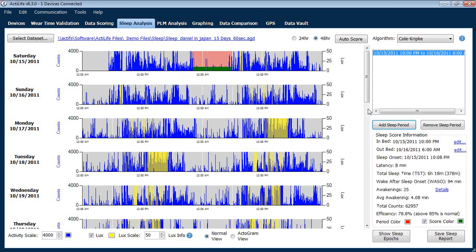Okay, a few things to notice here immediately. First, your new period has been added here. Second, we have highlighted that time span in the date on the graph that you've selected. You can do this as many times as you need for a single day or multiple days. You just keep adding them and they'll keep showing up, and you'll still get the results you require from them.